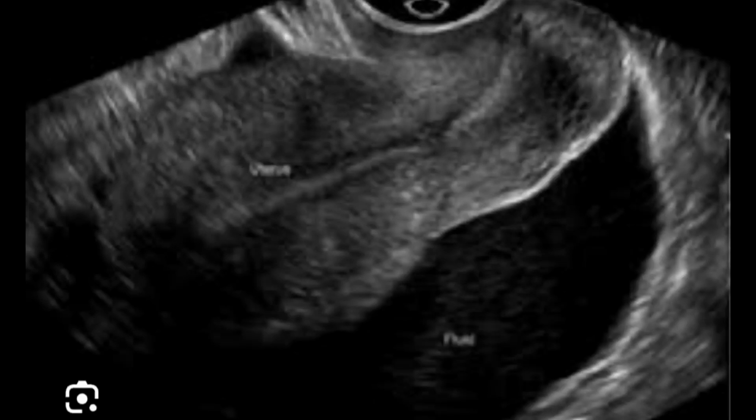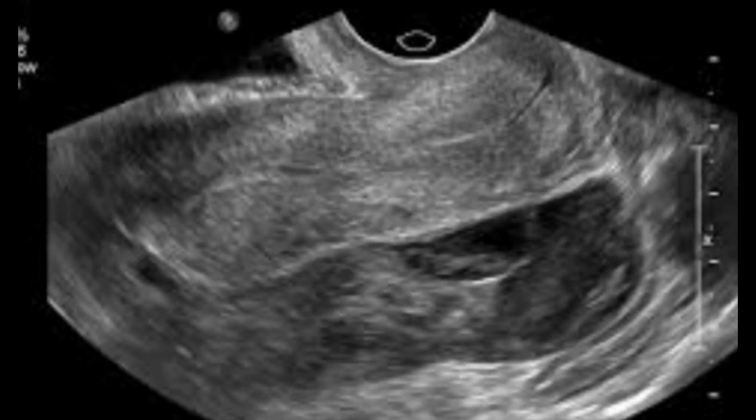So this is a case of pelvic inflammatory disease, and although it is a non-specific sign, by taking the patient history, by looking at the previous investigations and the medical record, you can still consider it as pelvic inflammatory disease. This is another complicated slide, rather I would say, because on first instance it will look like soft tissue, but actually this is the pouch of Douglas, and in the pouch of Douglas complex fluid is accumulated.